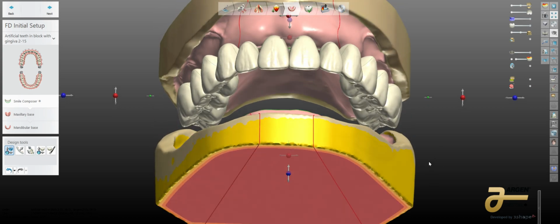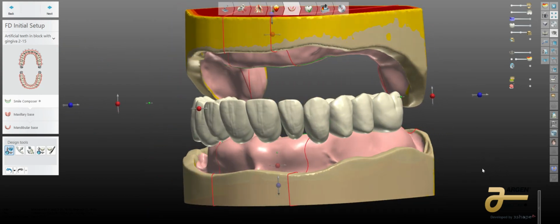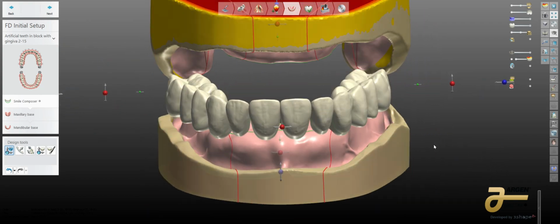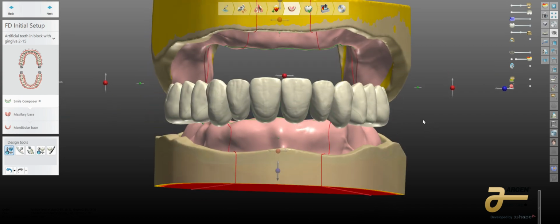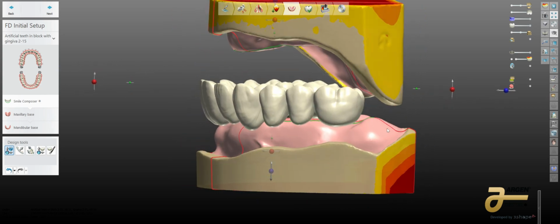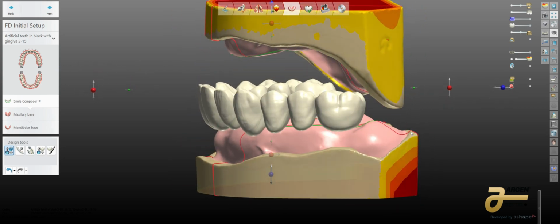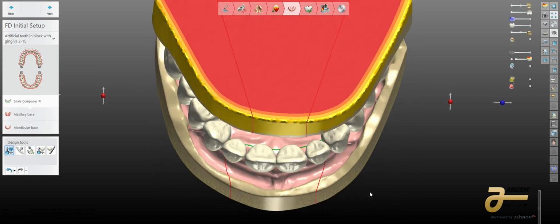And then we're going to utilize the flanges on our dentures to support these teeth in a manner that is going to force the bolus of food over the table of the actual teeth. All of these little things are no different for All-on-X, except for the fact that now we have it implanted, retained and supported rather than a muco-style denture.